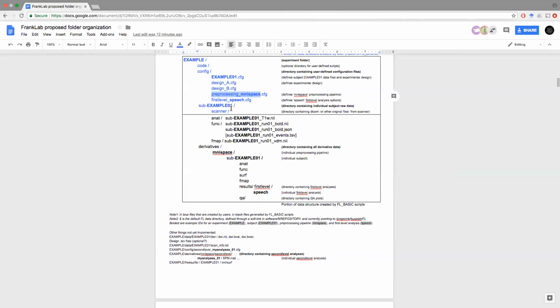The two things are basically the ones that I mentioned. One is specifying where the FreeSurfer data is, and the second is changing the processing pipeline to actually put your data in the proper surface space. And we'll see how to do that right now.